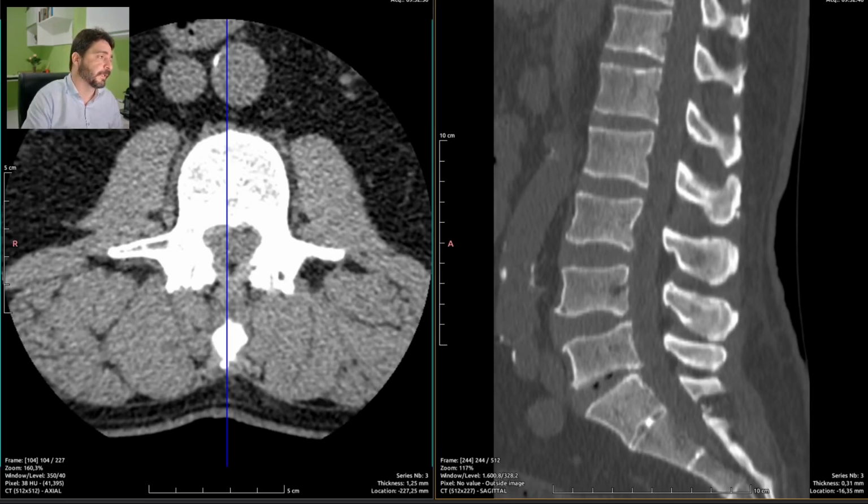Yep. Type in. The vertebral bodies have normal height, but they have these degenerative signs, which I'm going to describe now. We have normal heights and marginal osteophytes, sclerosis, cortical irregularities, so we have that.